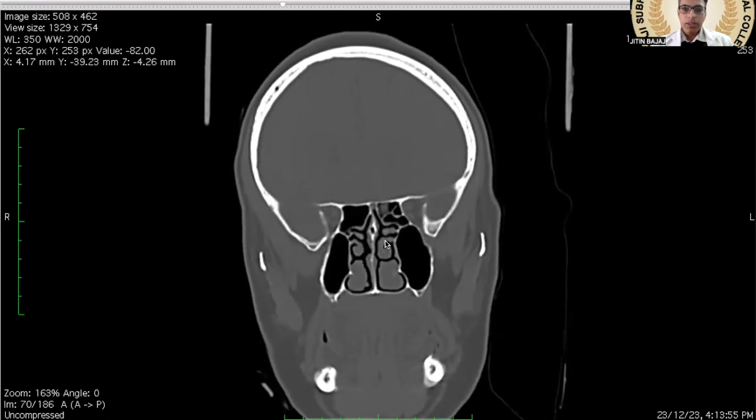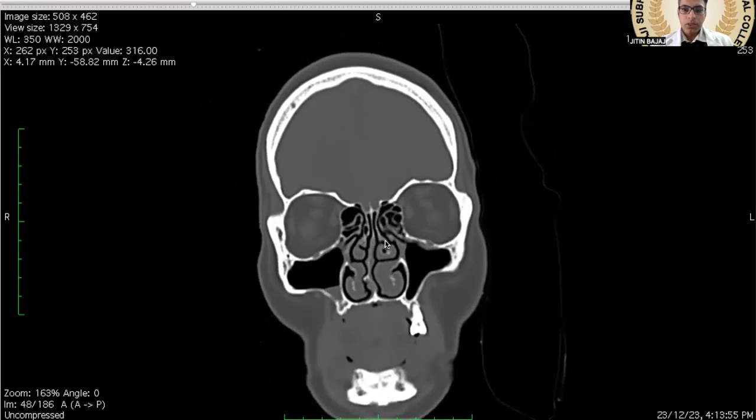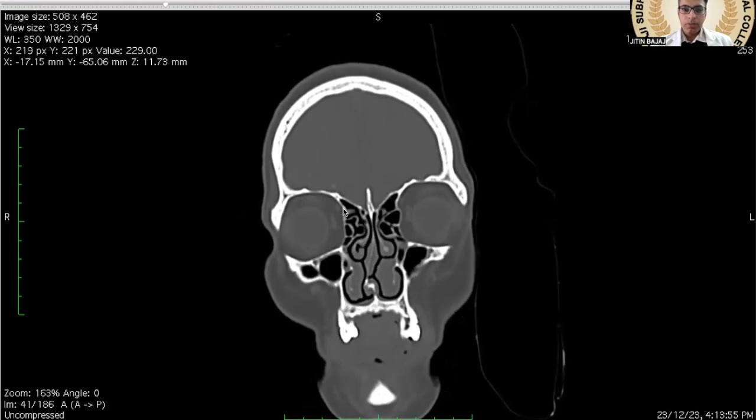Another important thing is to look for the anterior ethmoidal artery. So the anterior ethmoidal artery comes out from the orbit, where the orbit forms a beak-shaped structure, and this is where it comes out between the medial rectus and superior oblique, as a branch from the ophthalmic artery, goes to the skull base, then returns to the nasal cavity to supply the septum.